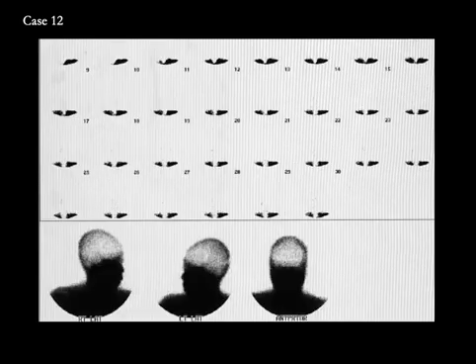Case number 12 shows imaging findings of a study positive for brain death, where the flow images do not show any activity going into the brain. This is the apex of the right lung, this is the apex of the left lung. There is faint activity in the internal carotid circulation seen on the right side, but there is no activity seen inside the brain. On the delayed spot views, we see photopenic defect in the brain, and there is scalp activity from external carotid circulation.